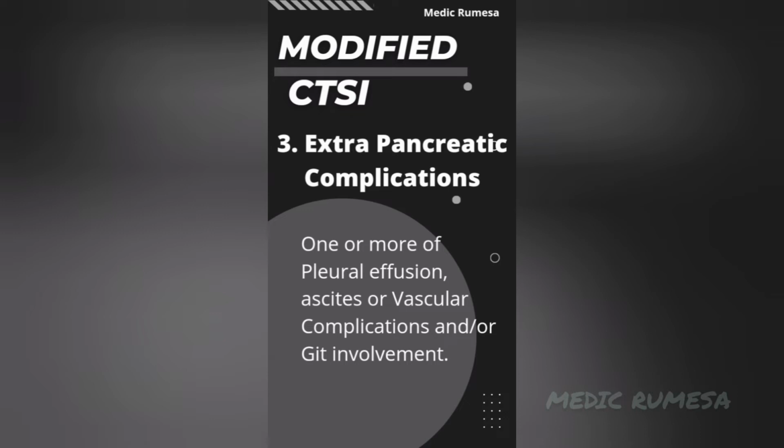And now moving on to today's case, on which we can apply the CT severity index and see where we can go. As the assigned numbers in this scoring system are all even numbers, the final score will always be an even number and not an odd one. So this is a small test on which you can judge your score.